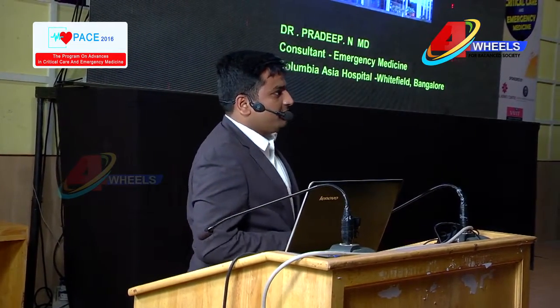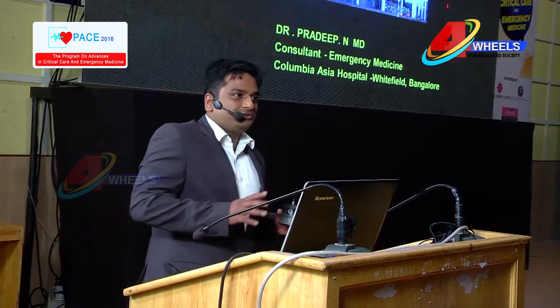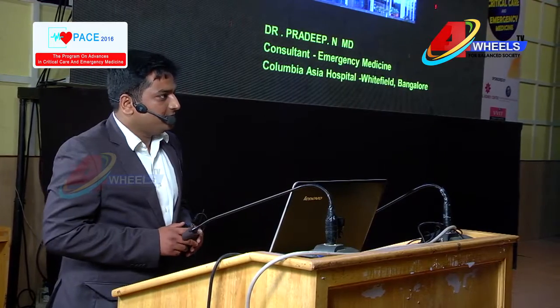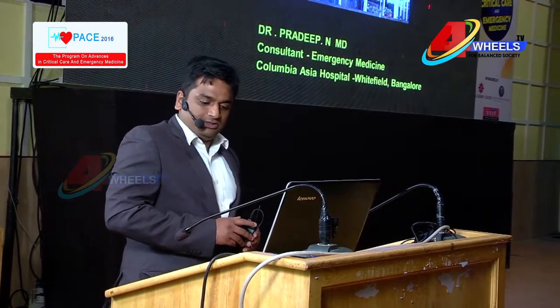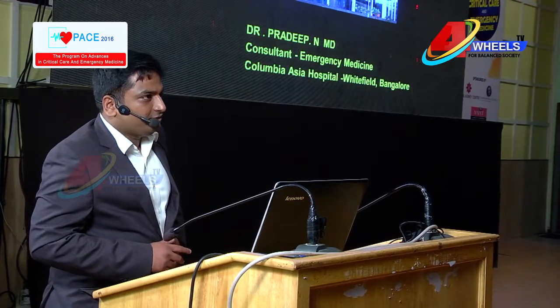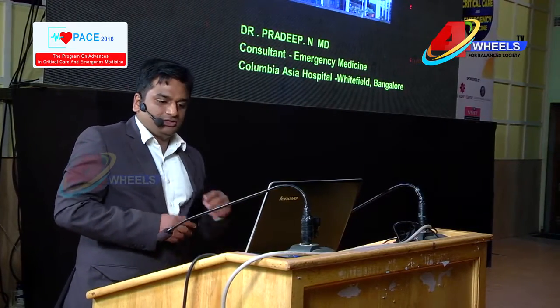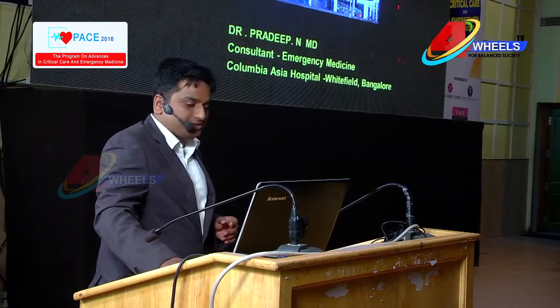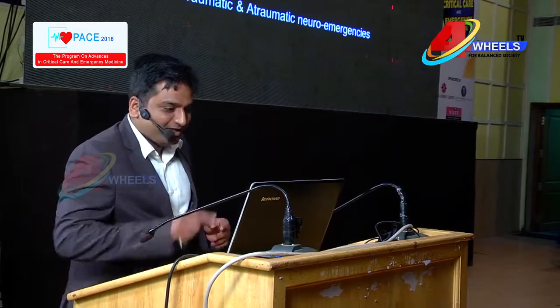I've made it very simple. A lot of pictures there. The whole point is to just identify basic anatomical structures which will appear on the CT, and there are only few life-threatening conditions which are quite important. Remember, I am not a radiologist here. I am an emergency physician.